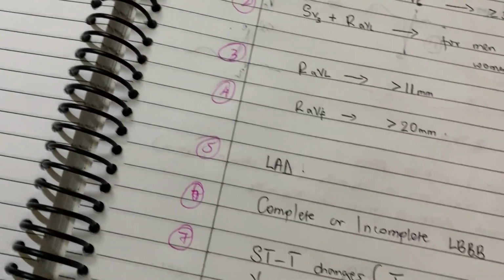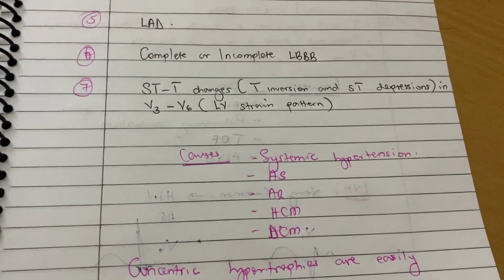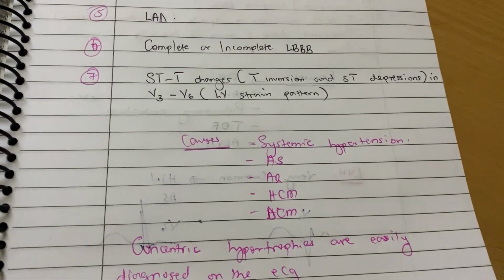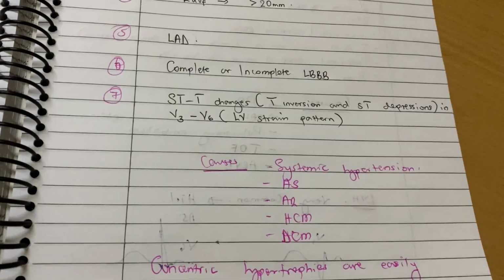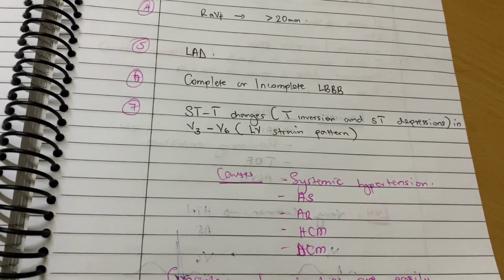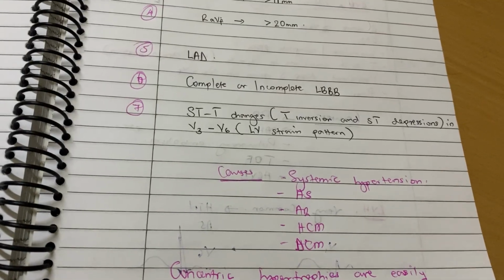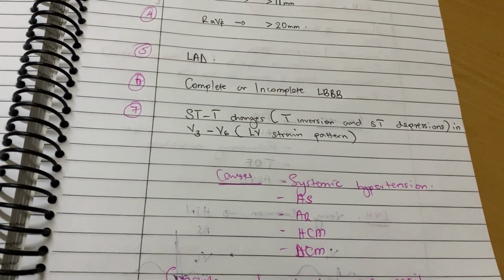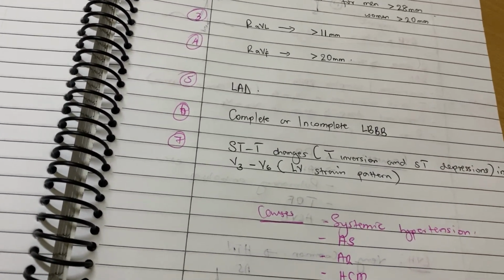Eccentric may manifest as other ECG features, frequent PVCs, or bigeminy, poor R wave progression. Another one is maybe nonspecific intraventricular conduction delay, bundle branch blocks, but changes in voltages not seen.